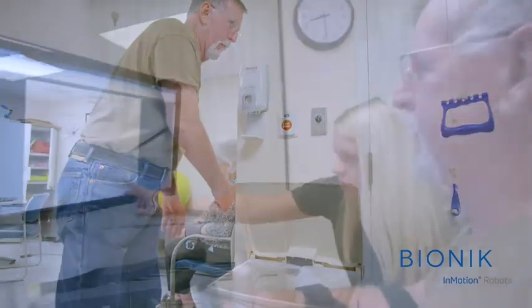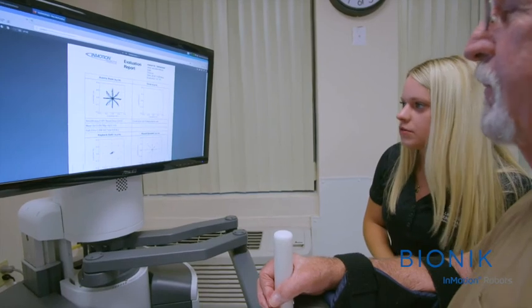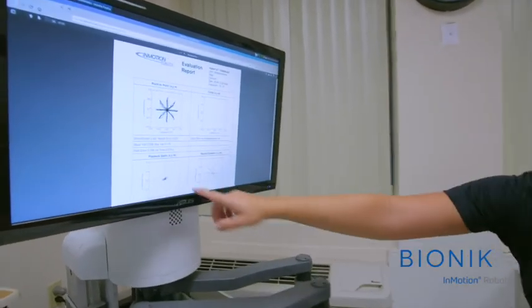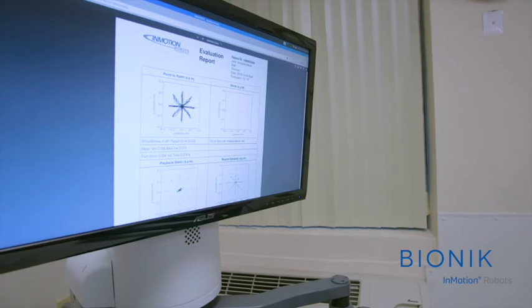Some of the features for the data that we can gather allow us to print out in graphical format that you can attach with your notes, and doesn't take a whole lot of advanced skill or advanced medical knowledge to read. You're able to look at the circle graph and you're able to tell, hey, the circle's more rounded on this side. It looks like they're reaching further.